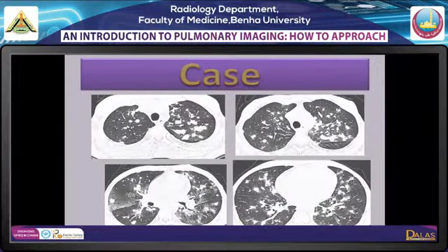الفايندنجز اللي described في الحاله دي are typical of Kaposi. نمره واحد الirregular large nodules دول بيتسموا flame shaped nodules. Number two, some of the lesions will have ground-glass opacification surrounding them. Number three, some nodules are lying on the fissure, زي ما حضراتكم شايفين هنا, or have pleural base. نمبر 4 prominent bronchocentric interstitial، البرونكاس والارتري اللي جنبهم شكلهم prominent.